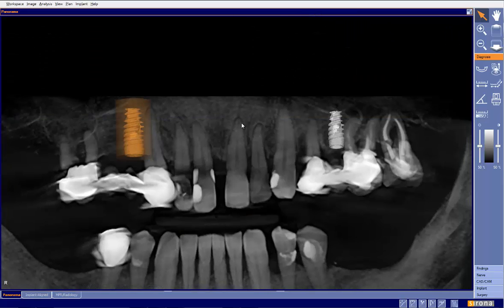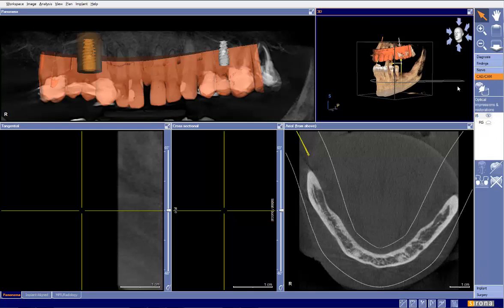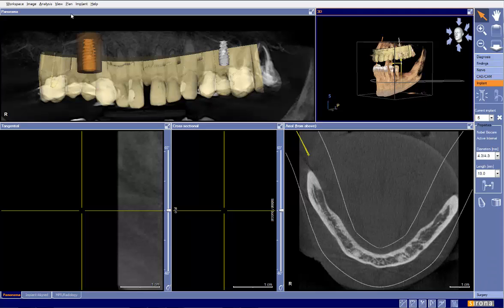So in a situation like this, what we do want to do is plan the implant in an ideal place through a tooth so that if we ever wanted to use it as a fixed implant bridge, implant and abutment, we could, but we also want to plan it so that we can do the overpartial at this time. So let's go ahead and take a peek. In this particular case, the submitter is a CEREC user, so they did plan the CEREC data, and everything looks fantastic there. So I would like to go ahead and start with site number 5.